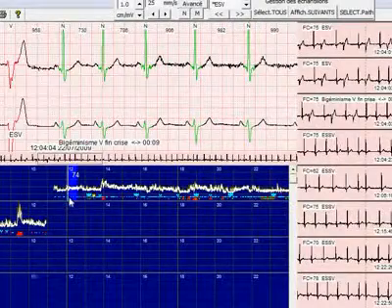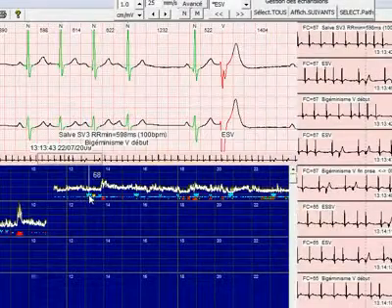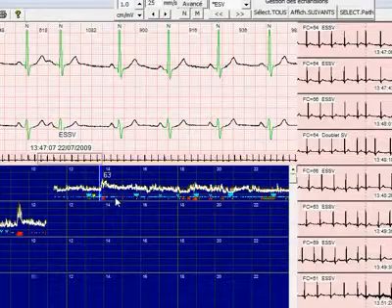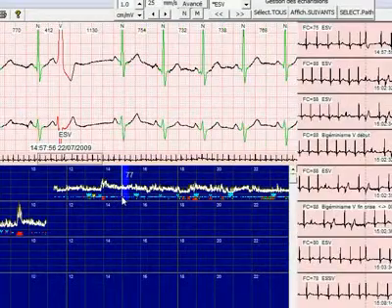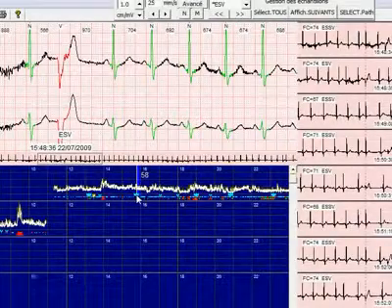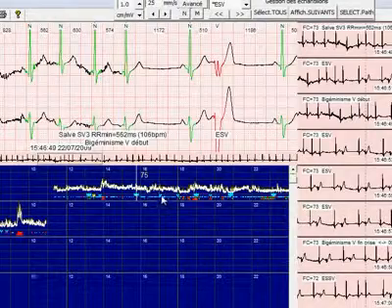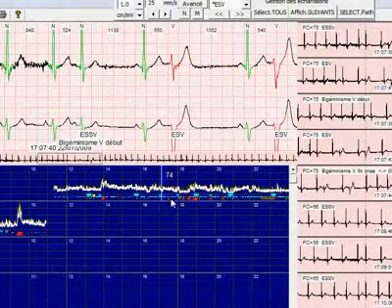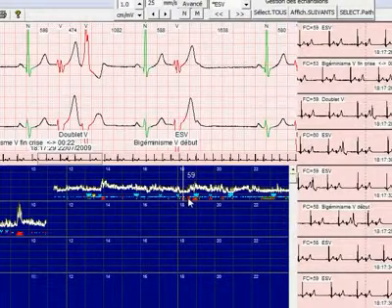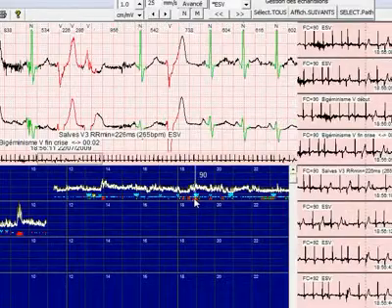For example, click on these icons to observe the ECG. A good QRS detection and its classification are verified. The supraventricular QRS are displayed in green and the ventricular QRS in red. Search for over-detections and under-detections. In case of an error, you can correct it locally. If it recurs, it is advisable to observe the classification graphic to correct this error in a very timely manner.